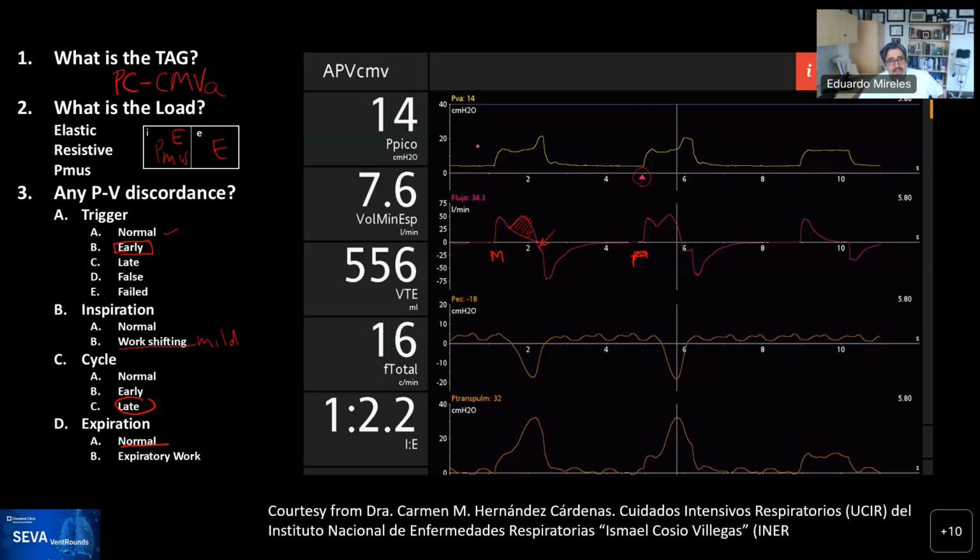So remember, the pressure inside, the airway, Pin, minus Pout, the pressure outside. This plus this gives you this waveform here. The key part, I'm going to forget for now about the transpulmonary pressure because it's not relevant for the synchrony issue that we're looking at.